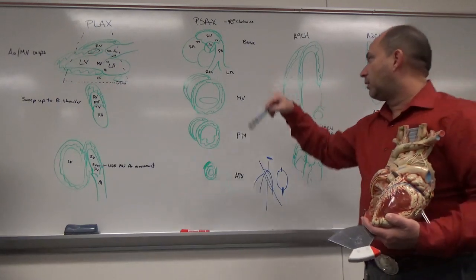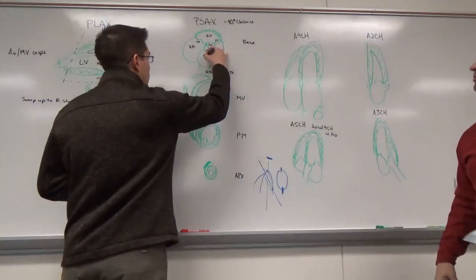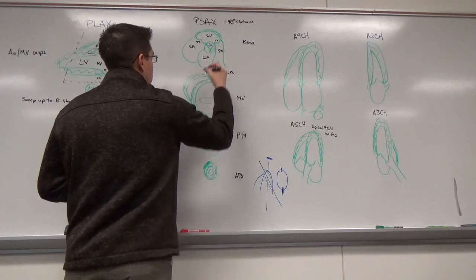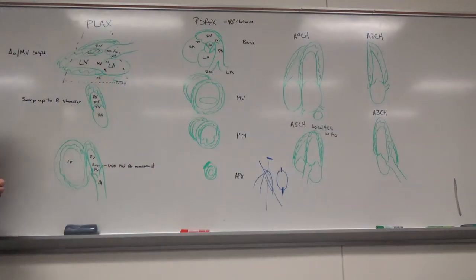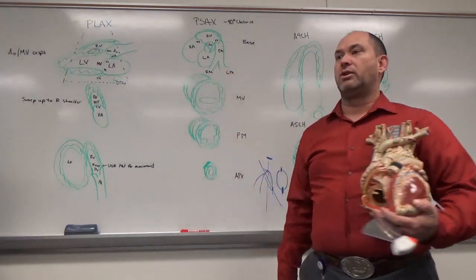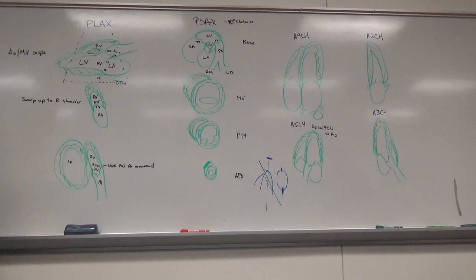Good, so we've got that. What is this right here? Septal wall. Oh, it's the atrial septal wall. It's atrial septal wall in particular, and that's the left atria. So know what septum it is you're looking at. Okay, what happens to sit in that interatrial septum that could be significant? Like a defect? Could be a defect.